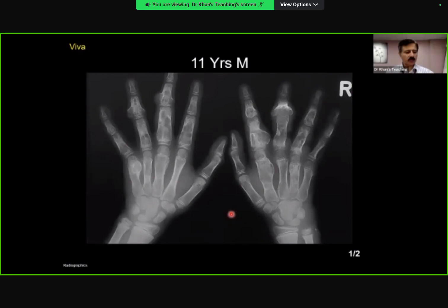I would evaluate for Maffucci syndrome, please. Sorry? What is Maffucci syndrome? You just said Maffucci, so what is Maffucci syndrome? So I believe it's the coexistence of multiple enchondromata with vascular malformations. And one thing that I would look for is obvious soft tissue abnormalities or calcifications within a slow flow vascular malformation to suggest that diagnosis. Excellent. Do you pick up anything in this case? There is a soft tissue calcification adjacent to the left ulna, right ulna.